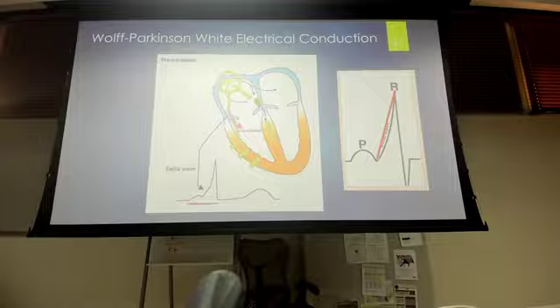But oftentimes, sometimes that change in the upstroke of the R wave is a little bit difficult to see. Your first indication is, why do I have a short PR interval? What's going on? That's going to be your differential. For a short PR interval, it should be WPW, Lown-Ganong-Levine, and electrolyte derangements can cause that as well.